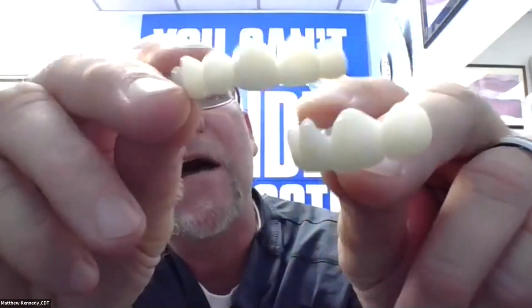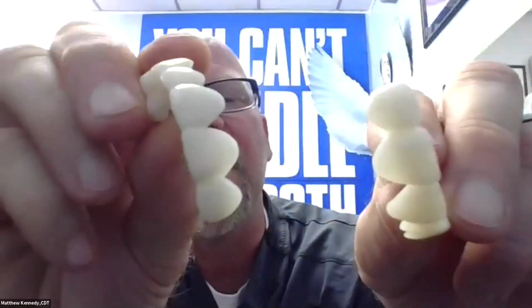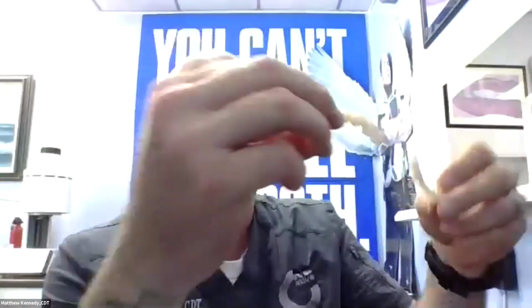The temporaries, I know it's going to be hard to see. One is glazed, one is not. One's high polished, and I know that really is hard to see. But there is hardly any difference between these two. If it's going to be a temporary, I would actually not send it to them glazed, but high shined, in case they have to adjust and grind, and then they go, well, how'd you get it that shiny? They can always polish it.